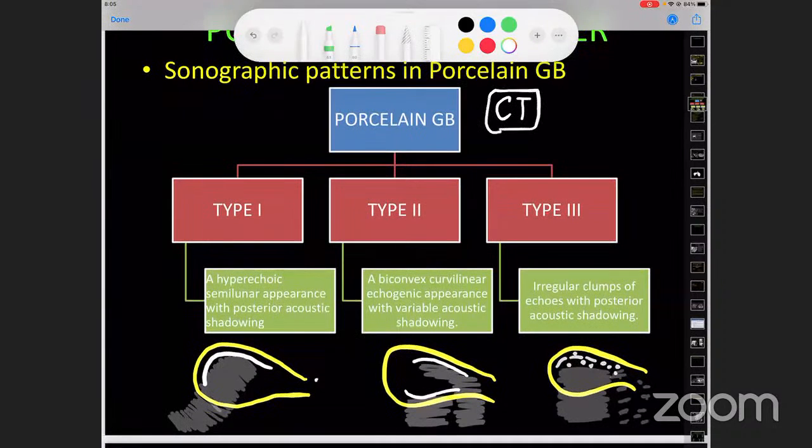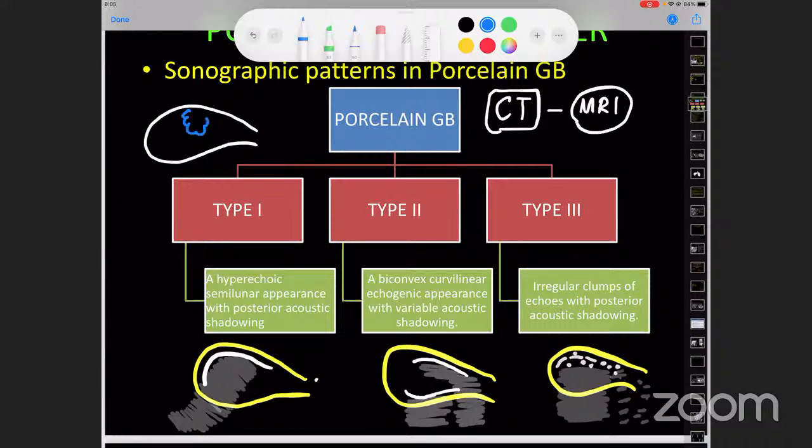Okay, right. Because the next day when you talk about cancer gallbladder, we're going to talk about it. In this one, do you think an MRI is a better one than a CT? Though I know that calcium is better picked up on a CT scan. Yeah. Okay, because you see, when there is smoke, there is fire. When you have calcium, we are all thinking of a cancer.